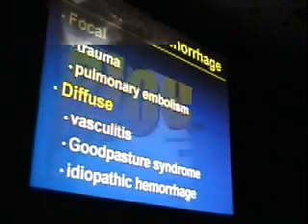Wouldn't necessarily be thinking about edema. Unilateral alveolar proteinosis is pretty unusual. Then I'd be thinking about things like bronchoalveolar cell carcinoma, maybe a pulmonary lymphoma, or maybe one of the other unusual, but non-infectious inflammatory conditions. In this particular case, I happen to know that this was blood.